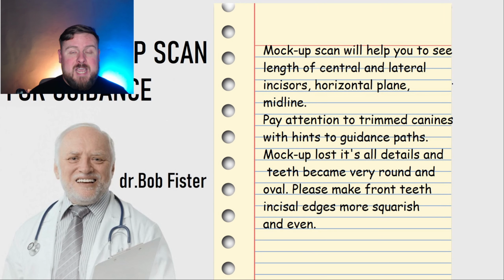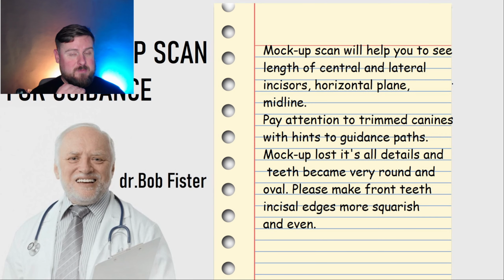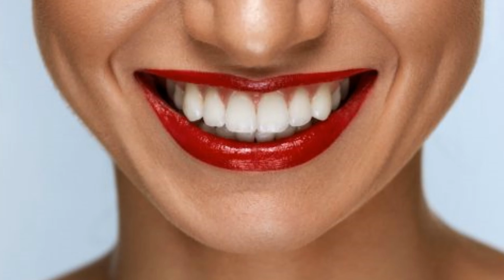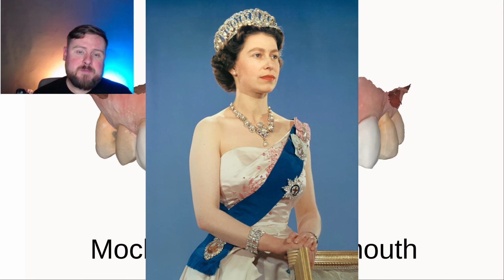Use the mock-up scan as guidance because, pardon me, there is no face bow registration or jaw movements and no photography for you. But we have a mock-up scan which was checked by a doctor and he said it's okay, just make the teeth more squarish, make those incisal edges more flat, just because the patient would like it to look flatter, like in most scenarios. Do not make the patient look like a 16-year-old girl because it's a lady. She's a solid, respectable lady in her 50s.